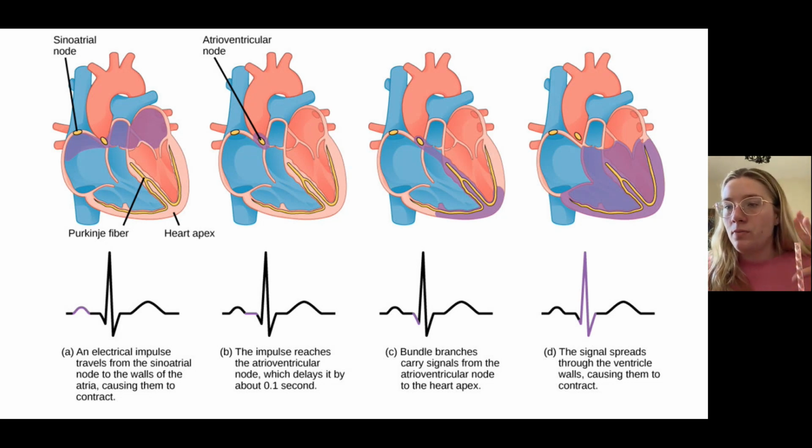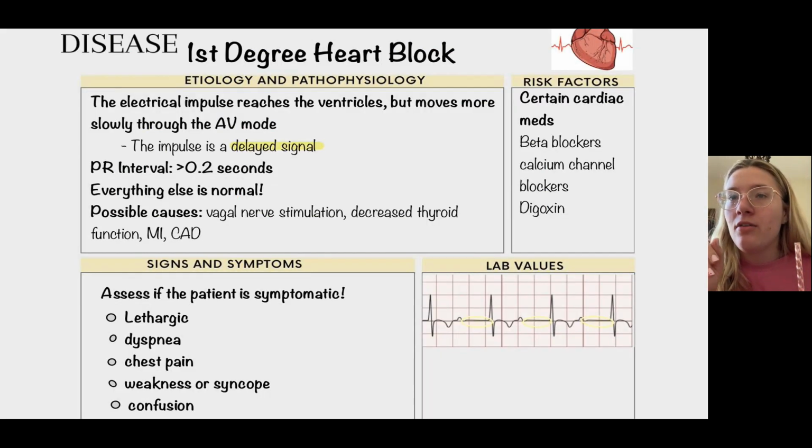But what happens when I squeeze and then my ventricles are full, but then they're waiting a little bit of time? My ventricles are just hanging out, and then they squeeze. That's what we would call heart block, specifically first-degree heart block. So as you can see in the photo down below, what's odd to me about heart block?